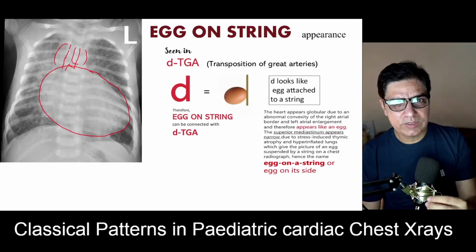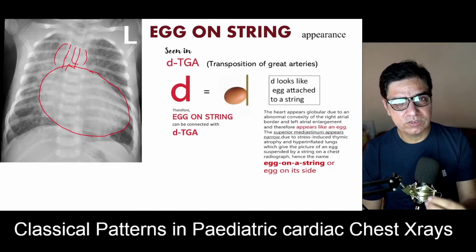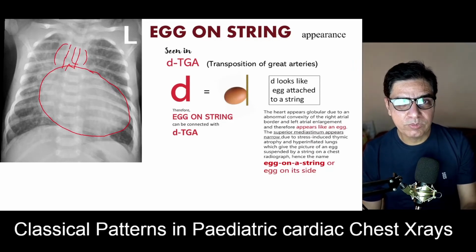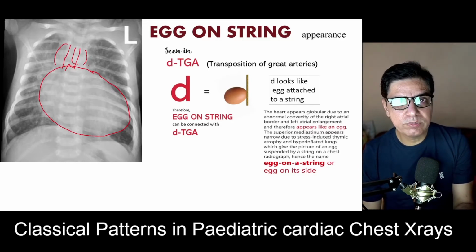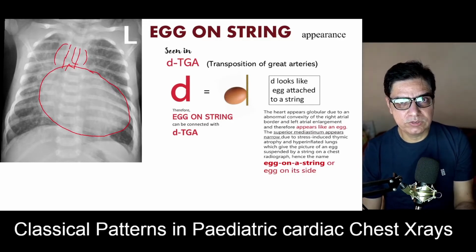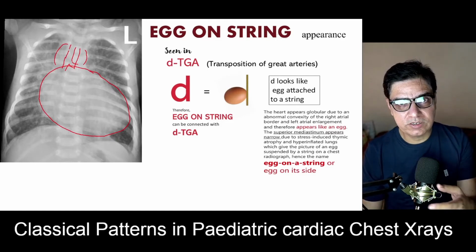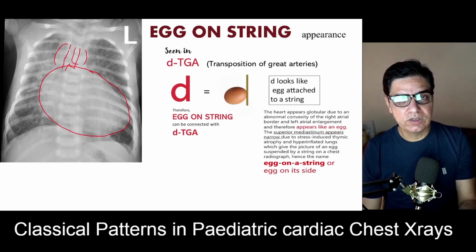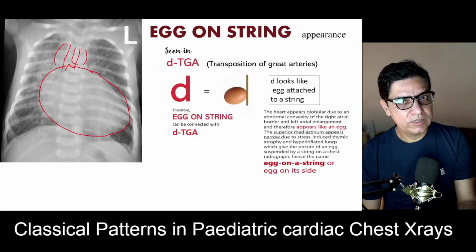So along with congenital diaphragmatic hernia, the other common reason that can cause cyanosis right at the time of birth is transposition of the great arteries. In that case, if you do a chest X-ray, you might get, I'm using the word might because in many cases you might get a normal chest X-ray. And I told you a normal chest X-ray does not exclude this condition because of the low sensitivity of chest X-rays. Obviously, if you suspect this, you have to go for an echocardiography.